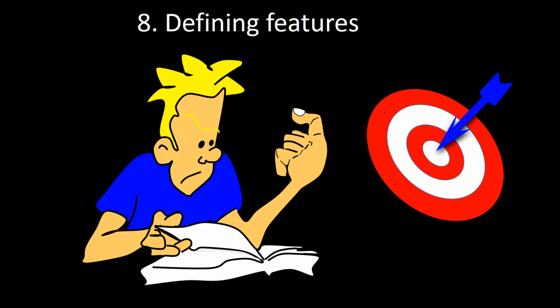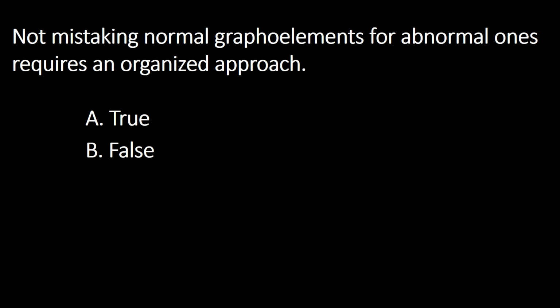The last and most important step in analyzing a grapho element is to select among all those features those that are most distinctive and that allow the separation of that grapho element from other benign or pathological grapho elements. So the answer to this question is true.